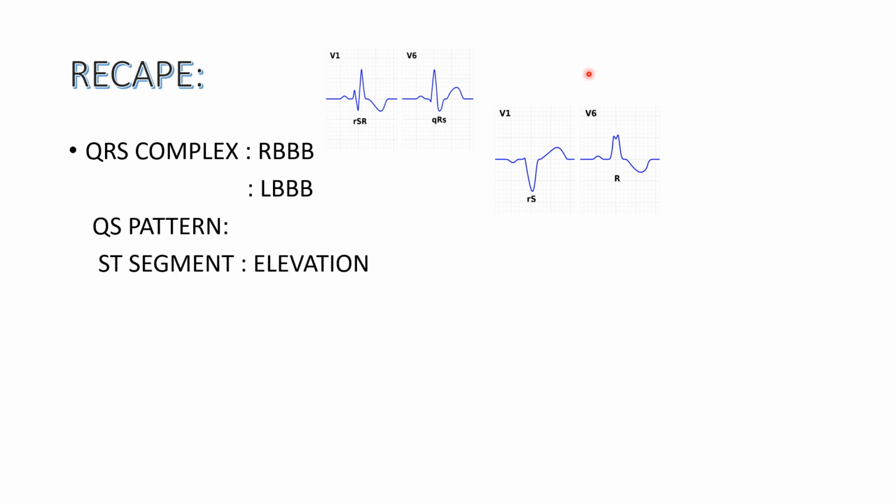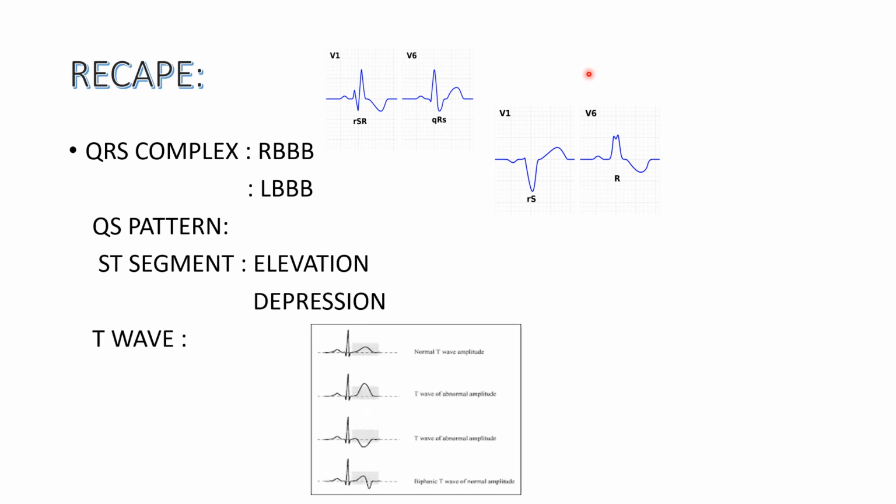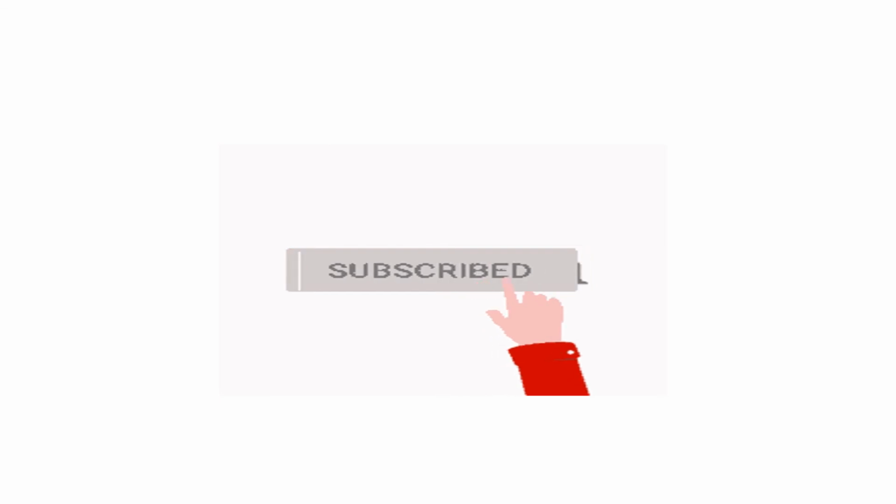Then we saw the ST segment, where there is an elevation or a depression. Then we saw the T wave. In the T wave, we saw the tall tented T wave, inverted T wave, biphasic T wave, and also the flat T wave.